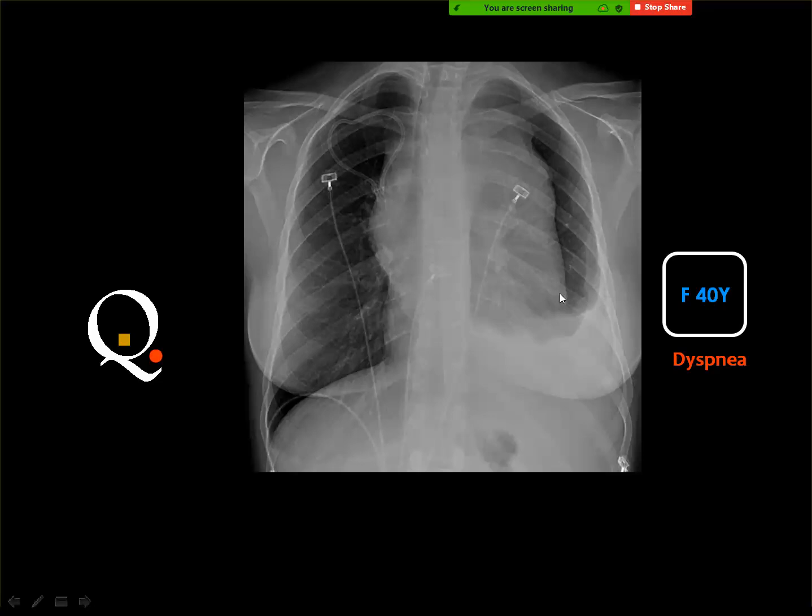Lymphoma. Okay. Then let us assess all the possibilities. Retrosternal extension of the thyroid: if you see the upper border of the mass, this will exclude this possibility because in retrosternal extension, you cannot see the upper border of the mass. Then lymphoma is a very good possibility because there is a big mass on either side of the mediastinum. If this is an aortic aneurysm, it will be located on the left side and centered to the region of the aorta. This broadening of the superior mediastinal shadow in the pediatric age group and in adults is almost always suggestive of lymphoma until proved otherwise.